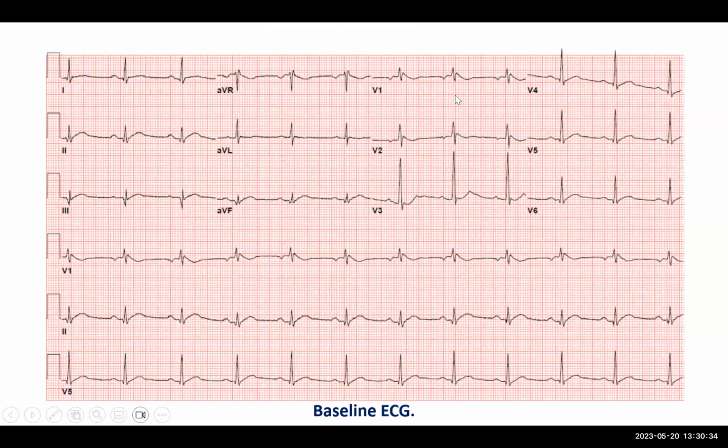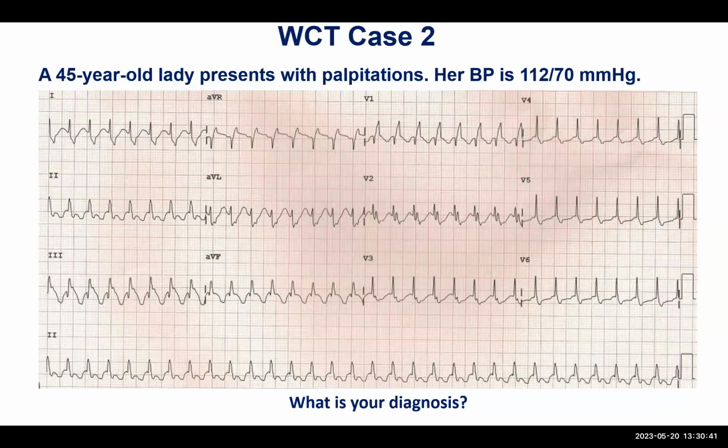This is his baseline ECG, showed you that there's difference from tachycardia and baseline ECG. So this is not supraventricular with aberrancy. The second case, actually, most of you got it right also, because this is very typical right bundle branch block, RSR, deep S wave in the inferior leads. We don't see any other criteria. So the AVR is negative. The initial part in lead 2 is sharply positive. So everything is pointing towards SVT with bundle branch block. The patient baseline was actually right bundle. So when the patient developed SVT, of course, he was still having right bundle with the SVT.